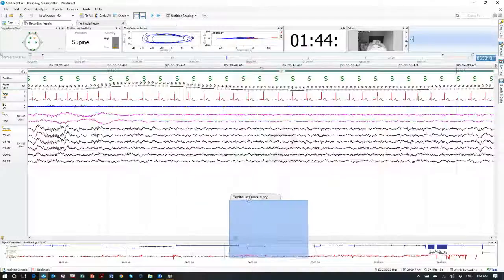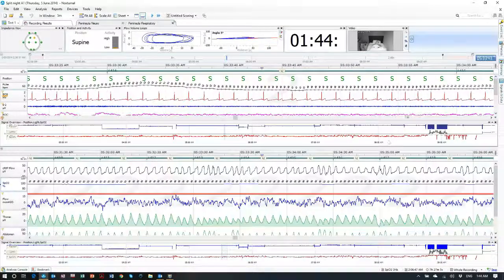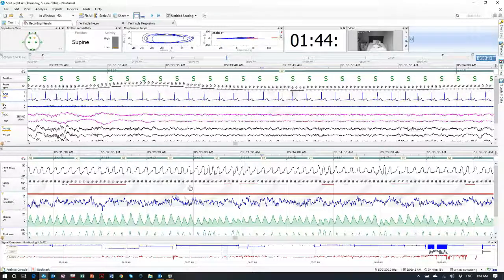Then we put them back together again, and we just do what we did before. Sometimes it's worth cleaning up the banners again, so we're uncluttering our workspace. I'm working with a laptop workspace at the moment, so it tends to cramp everything up and looks a bit over cramped. But if you've got a nice big screen, it's going to look much nicer than this. So just keep that in mind.